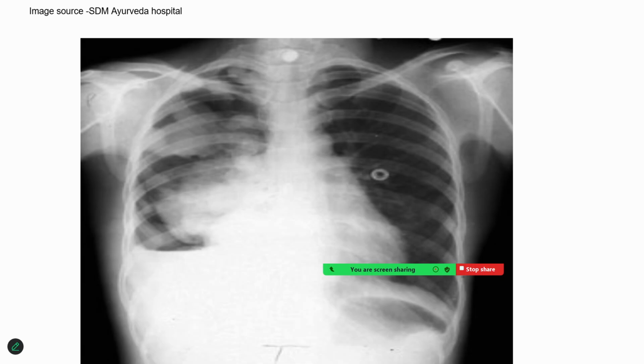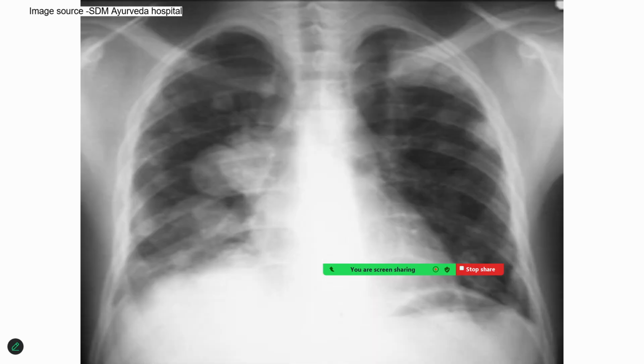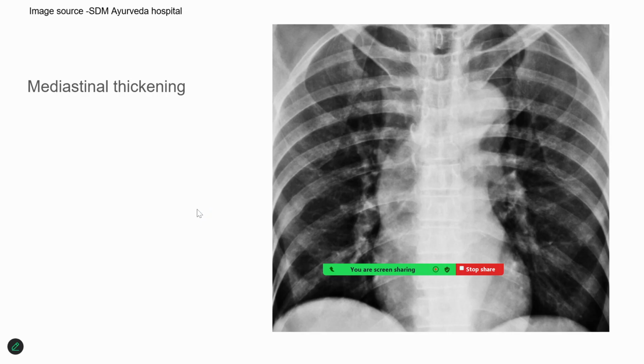Lung cancer can present with other complications like a pleural effusion. Multiple nodular extensions or even metastasis within the lungs can also occur, which would suggest more advanced lung cancer. Or there could be multiple opacities. These multiple opacities may be a sign of secondaries in the lungs. Among the tumors of the lungs, secondaries are more commonly seen in our setup than primaries, and these are the typical secondaries which may later result in what we call the cannonball appearance.